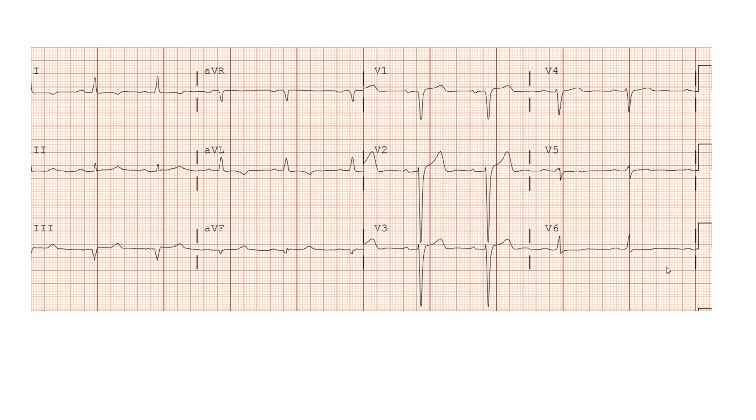How about this EKG? This is another poor R wave progression. This one is extending all the way to V5. What suggests a prior anterior MI here is you have Q waves in the inferior leads. So you already are thinking ischemic cardiomyopathy. The same way you have an inferior infarct, maybe this is an anterior infarct. And actually, it's probably an anterior infarct of a wraparound LAD that gives you inferior Q waves.